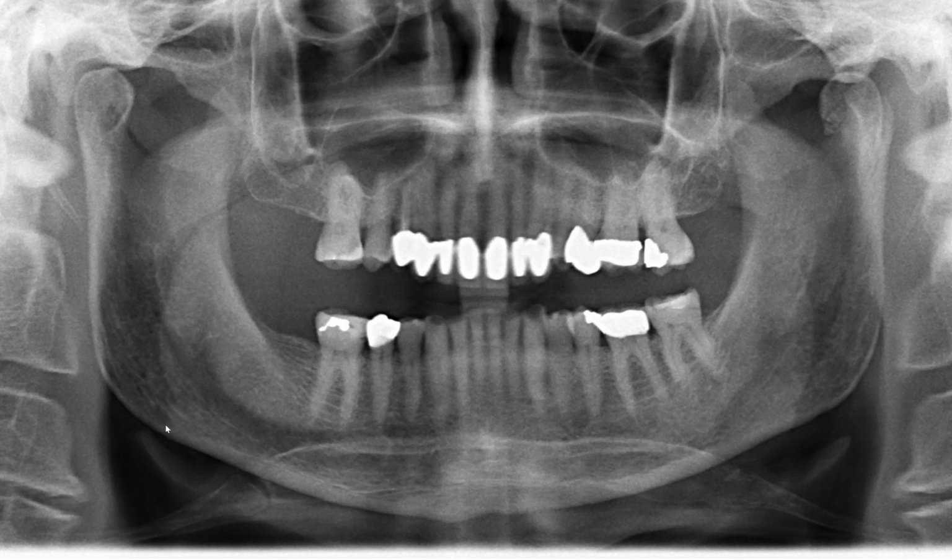You can compare that to the left side, and also look at the position of the condyle, where it is. Those are some of the things that you want to be asking yourself when evaluating condyles and the mandible in general after a trauma.